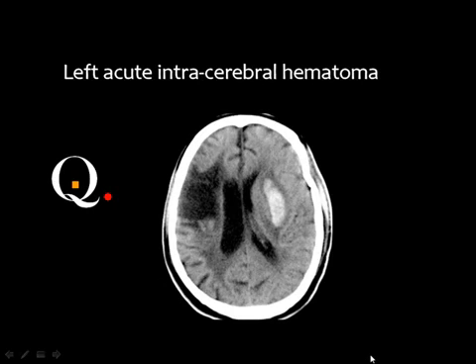Okay, yes. This is a good comment actually, and you see this area, which we call in the radiology reports an area of encephalomalacia. What do we mean by encephalomalacia? It is dead brain tissue, and the dead brain tissue may be the sequelae of infarction, of trauma, of surgery, of infection, or of a previous hematoma. Then how can you know that this encephalomalacia is the sequelae of any one of those I have mentioned? Then you should have the previous films and you should have the clinical data.